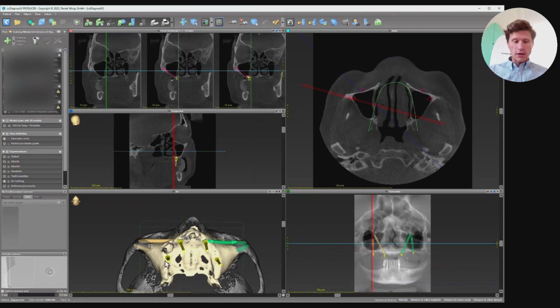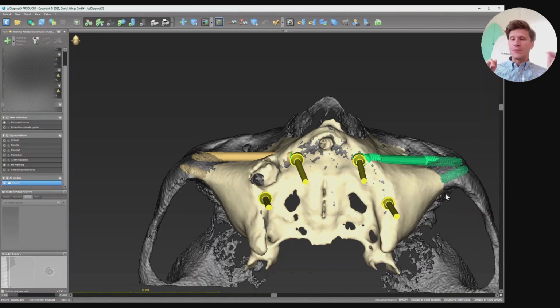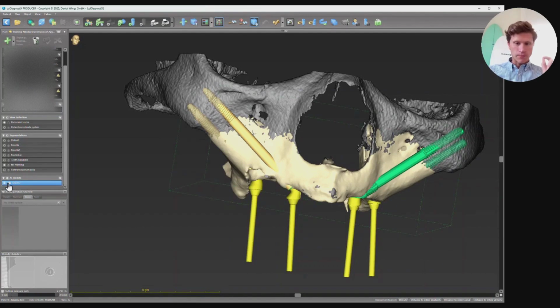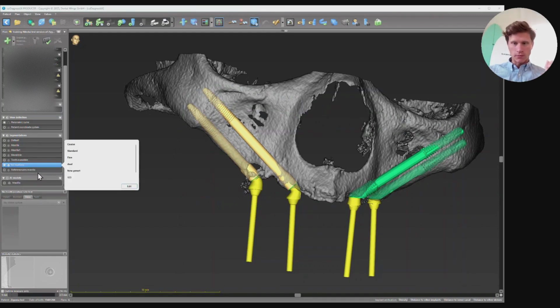And why did I do AI segmentation? Yes, you can create different levels of segmentation, but usually it takes a lot of time. And with AI, it's much faster and much easier. That's why I like to use AI segmentation for this purpose. And then, because I need a little bit more bone, I will merge AI segmentation and this segmentation. How to do that? My segmentation for maxilla, I can convert into a 3D model.